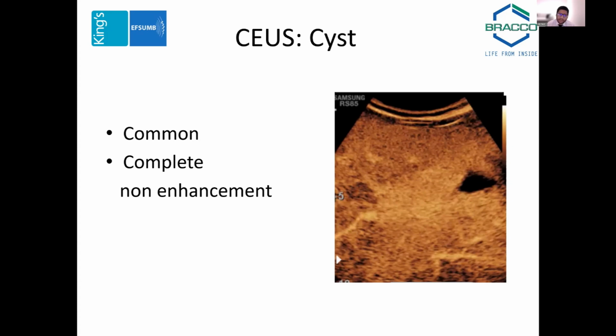But on the odd occasion, there may be debris within it. It may simulate a lesion. It may be completely filled. But the only way to be sure is then by giving ultrasound contrast, ensuring that there's no vascularity within the lesion. But this is a rare occurrence.